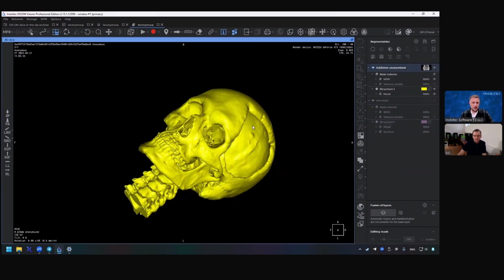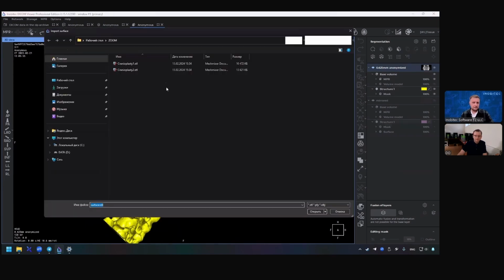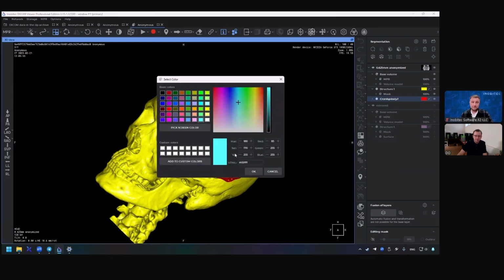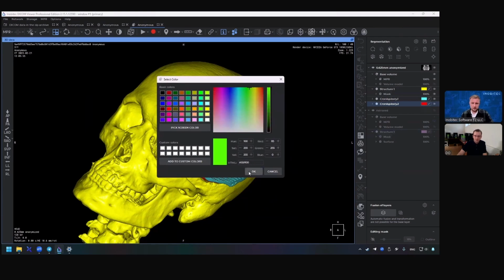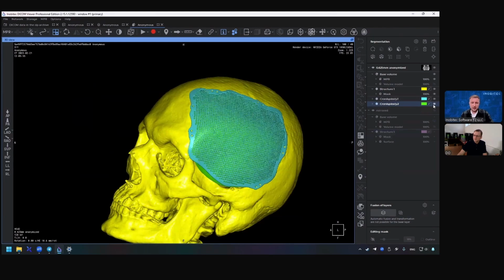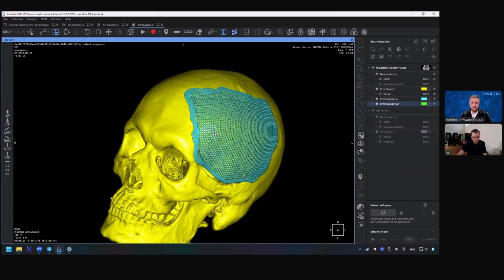Okay, I have done with this cranioplasty, and I have implants already prepared in Blender, with STL for titanium printing, SLM printing from titanium powder, and this one is for PMMA implant creation using our multimodal technique. Oh, so both of them you've made manually in Blender, right? Right, right. I prefer Blender.